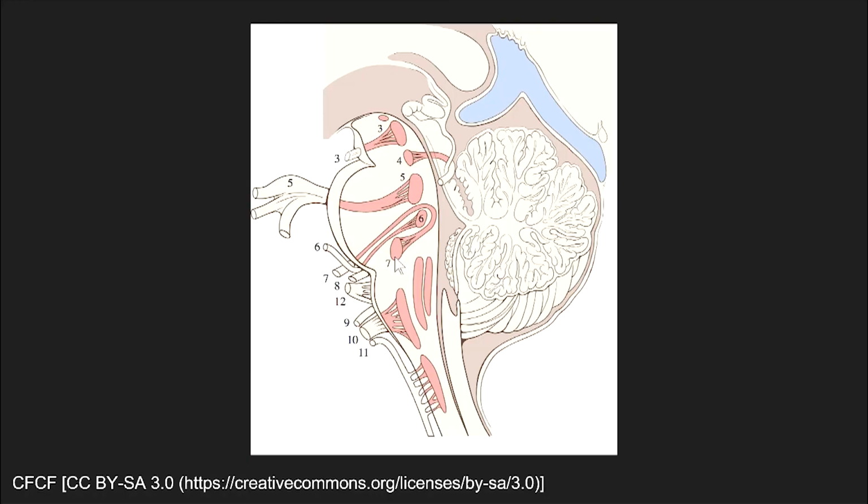Now, what's curious is in this sagittal diagram, which is anatomically correct, the seventh nerve fibers course in the brainstem for a variable distance, loop around the nucleus of 6, the abducens nerve nucleus, and then move forward as they create the apparent origin of the seventh nerve. So let's look at that in the axial projection on an MRI.